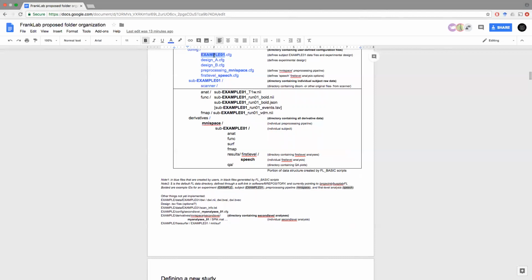Well, if you want to run surface level analysis, all you have to do is make sure that in the structural field of your subject level config file, you point to the same anatomical data that you use for running FreeSurfer analysis. Typically, that will be in a folder that is created by FreeSurfer and is called MRI, and the name of the anatomical file can be either one that is called t1.mgz, mgh, or .nii, or one that is called brain.mgz, mgh, or .nii. Either one of those is fine.